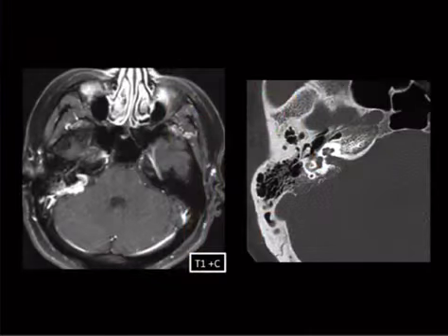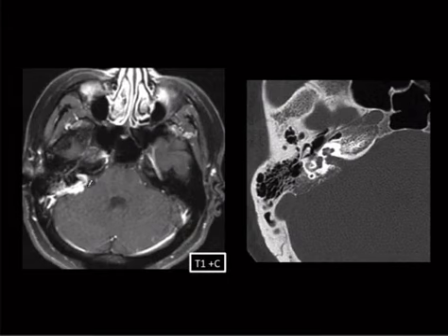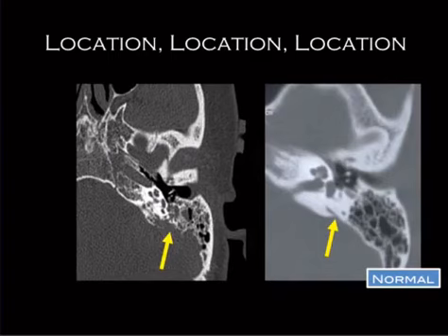All right, so that concludes our discussion on that. All right, next case. So we've got a T1 post-con. This is another thing that's avidly enhancing. And then it's another thing here that's sort of looking permeative. That was a buzzword we used for the paraganglioma, but this is not that same location, right? It's at a different location. So location, location, location.